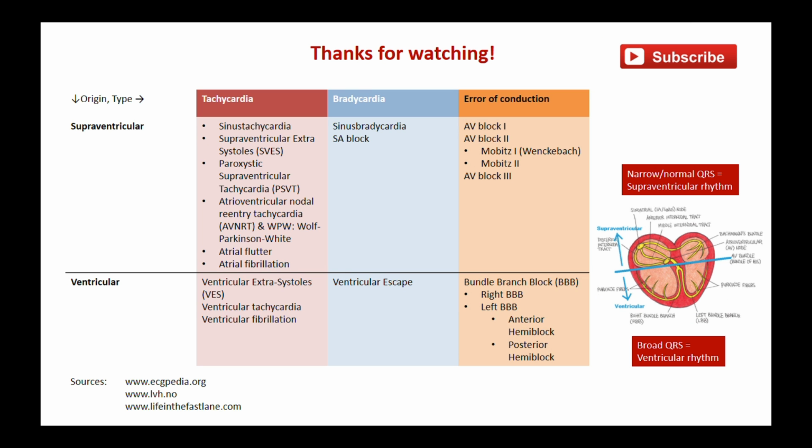All right, well done. Now we've reviewed different cardiac arrhythmias and how to see them on the ECG strip. And remember the golden rule: if it is a narrow or normal looking QRS complex, then you are most likely dealing with a supraventricular rhythm. If it is a broad QRS, you are probably dealing with a ventricular rhythm or arrhythmia.